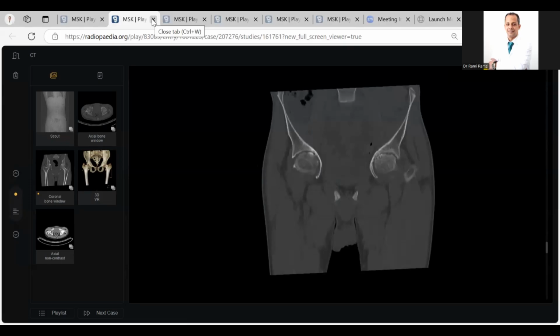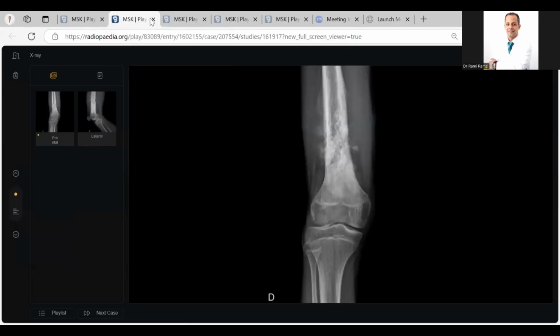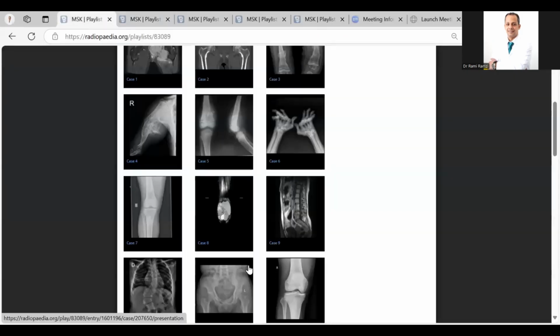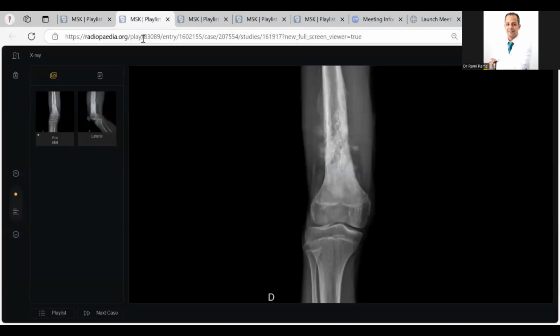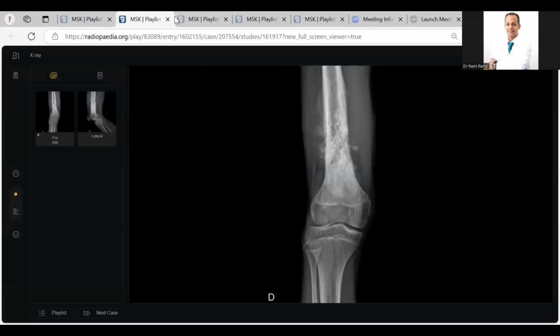Dr. Sobia was in the previous case. Which one? Inflammatory. Previous MR pelvis with inflammatory synovium. I thought that apple core sign was... Yes, apple core sign. So what was the diagnosis in that? It was osteochondromatosis.